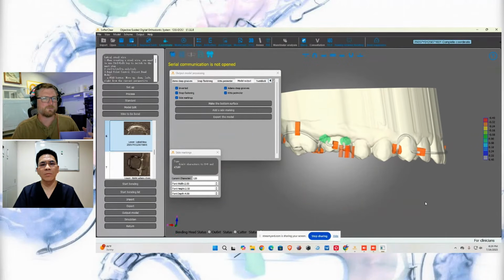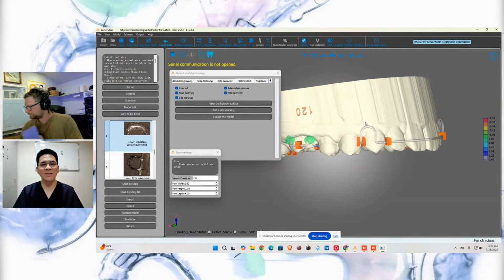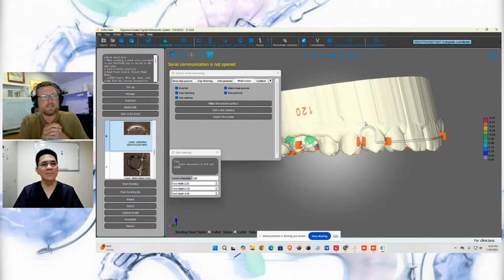Dr. Neal, let me know if I'm doing something weird. There we go. There's 120.